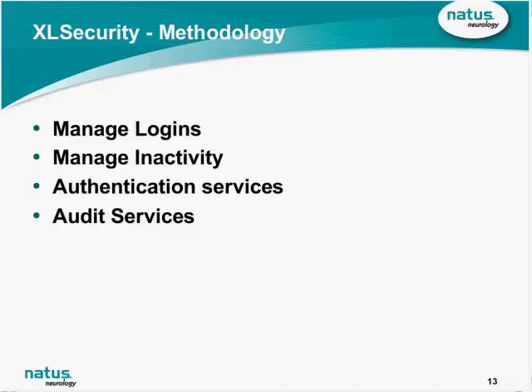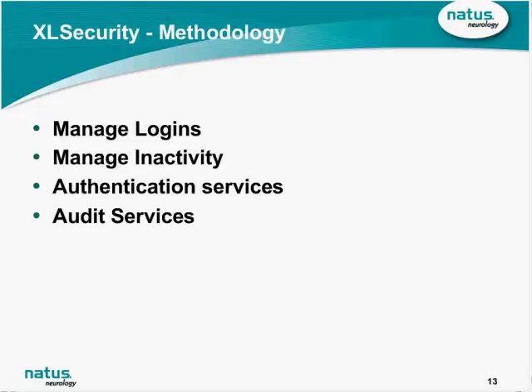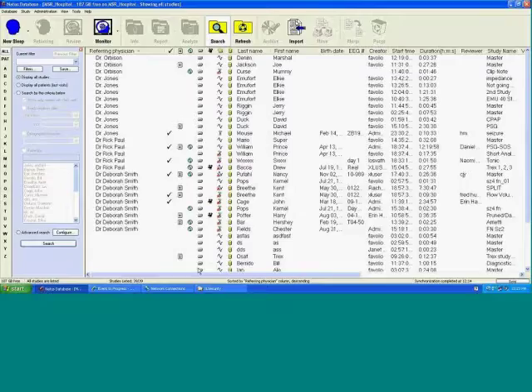What I want to do next is share my desktop and walk you through an example of how XLSecurity can be implemented on a particular machine. There are several schemes that you can employ, and I'll talk about the schemes later. But basically, what I want to demonstrate now is how I'm going to use these methods to implement a security system on my laptop here. All right, so I'm just going to share my desktop. And here I am at the database.